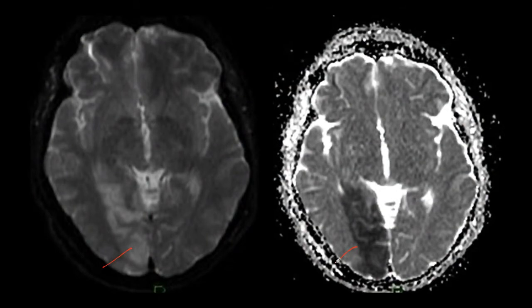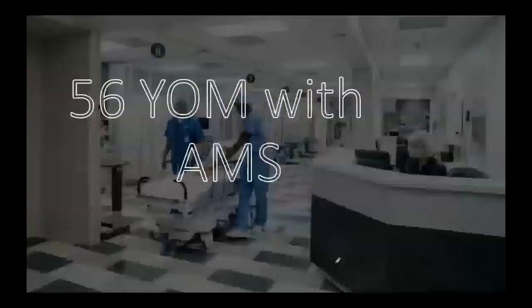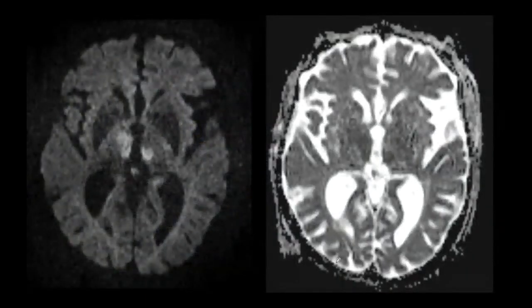Right PCA. Right PCA. Great. So it's an acute right PCA distribution infarct. I was just trying to cover some areas of distribution. So this one, anyone wants to take a shot at this one?